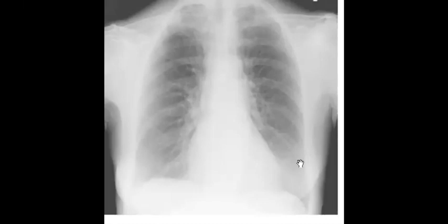And you will search for any lower lobe fibrosis, and finally any avascular necrosis, all this in rheumatoid because the patient takes steroids.